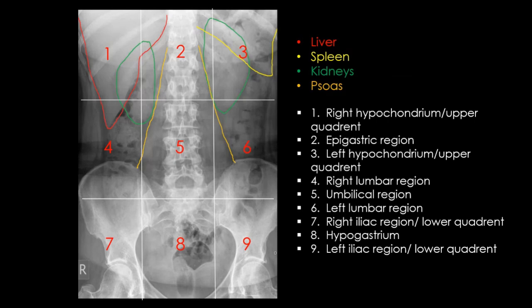Just a little bit about areas of anatomy. Because you've got bowel gas and fecal residue, and because a lot of the organs are of similar density, it can be quite difficult to see. The organs do have fat surrounding them, so usually you can see a faint outline, but it depends on the amount of bowel gas and fecal residue you've got going on there.